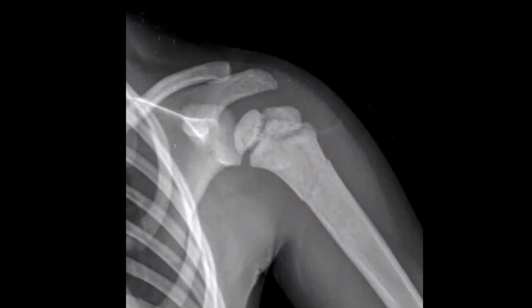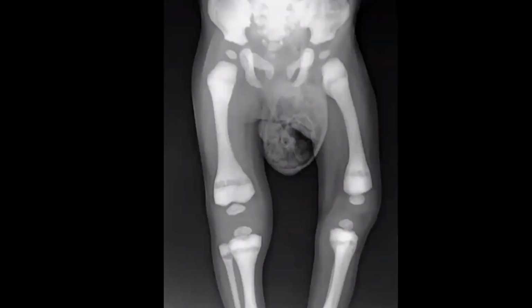So your differential diagnosis is osteopetrosis. What are the other differential diagnoses for diffuse sclerosis? As I remember, it could be pycnodysostosis. Very nice. Those are the main differential diagnoses. Yes, it could be fluorosis also. Okay, so can you see with me this other case?